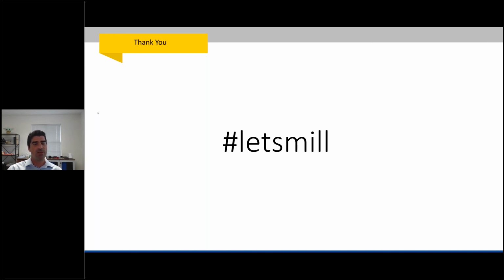So they have awesome features like TeamViewer, so you can share screens with them and they can see what's on your screen. You want to save any case like that you're having any kind of trouble. There are two ways to do it, but the easy way is to click on that white bar on the top of Millbox and then click on support and then save file, I believe it is the name of it. You want to save that file that you're having any trouble on so that when you call Zahn, they can see exactly what happened, same as what was on your screen. That's a great question. Thank you.